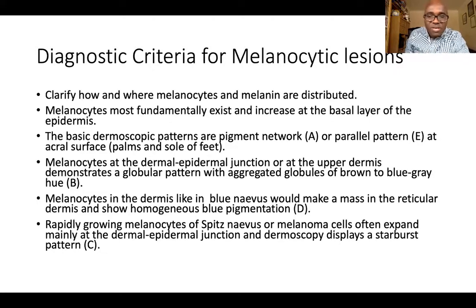It has a starburst appearance. I always go back, as a GP, to understanding that when you see streaks, or even a starburst appearance, your dermoscopy still gives you assurance that this is a melanocytic lesion, a Spitz nevus, with diagnostic criteria of a melanocytic nevus.